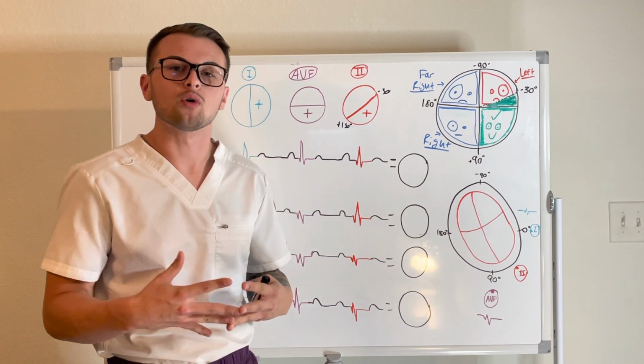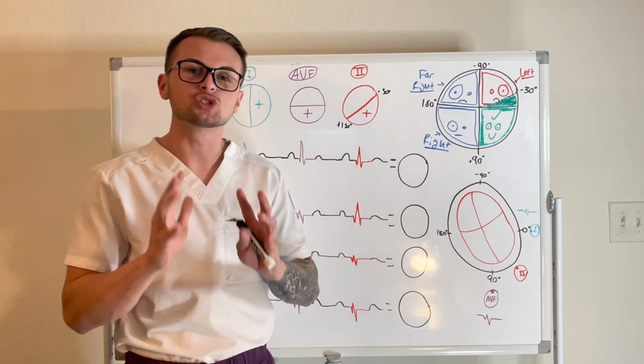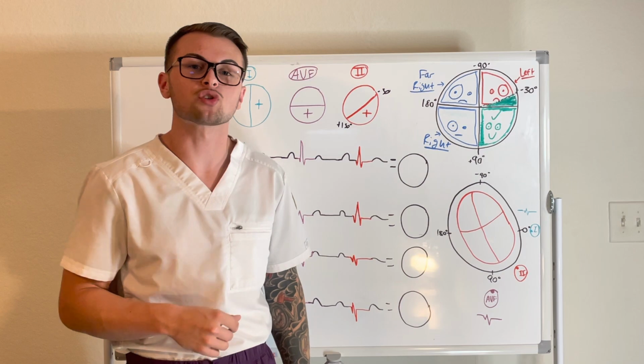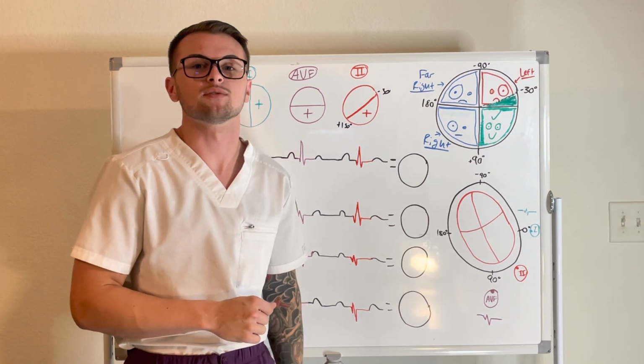Today we're going to go over how to determine if your patient has an abnormal electrical axis. It is so simple, and if you haven't watched our video on how to determine the normal electrical axis, please do so now so that this video will become so easy to understand for you.